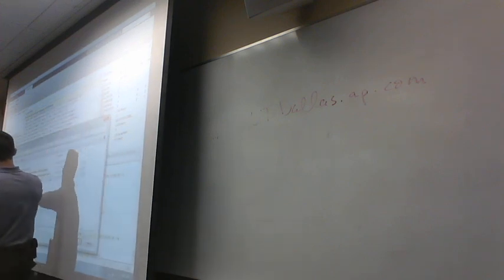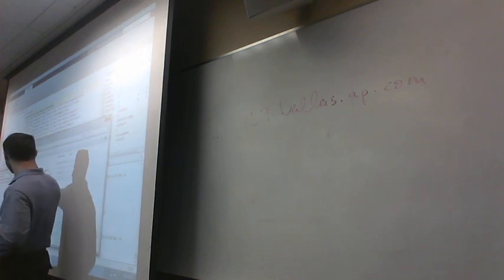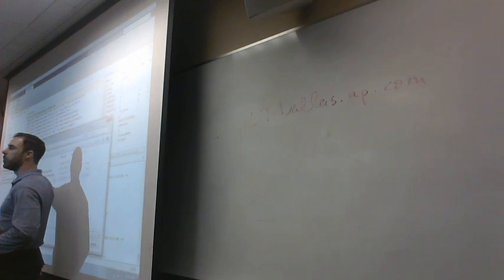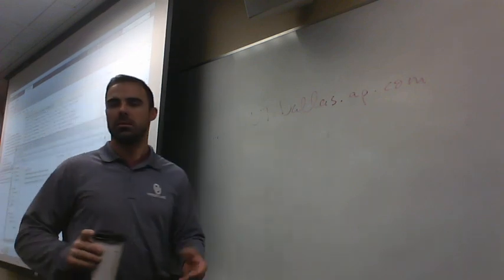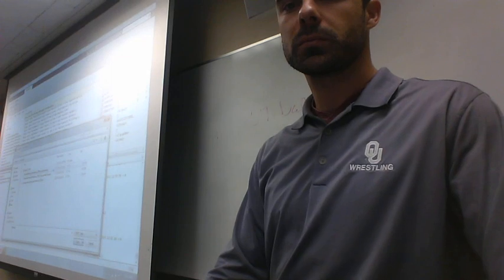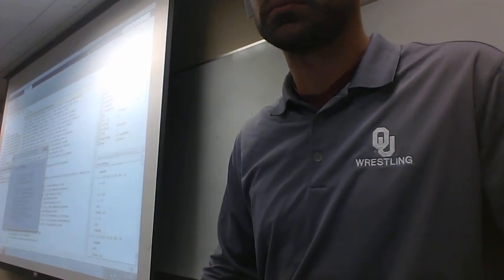One of the things we'll talk about is how we name files. This is a really long name, and in the style of naming that I use, every time there's an underscore, it means we applied a different function to the data. So we're going to start at the very base level of data here. Let's go back and X out of here.